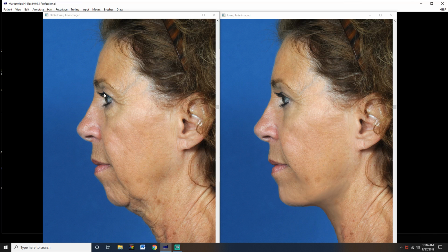Now we can see where there was the skin looping out. We've tightened that up. There was our edge of our skin that was hiding the upper eyelid. We pulled that back and brightened up the upper eyelid to demonstrate where the natural rim would be. Tighten a little bit on that lateral rim of the eye, and the upper eyelid blepharoplasty from Profile is done. Let's go ahead and show our patient with the soft compare.